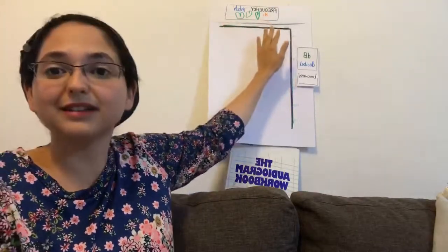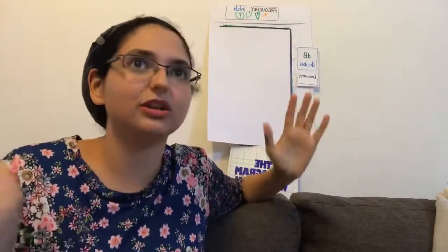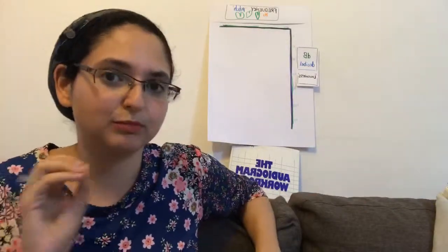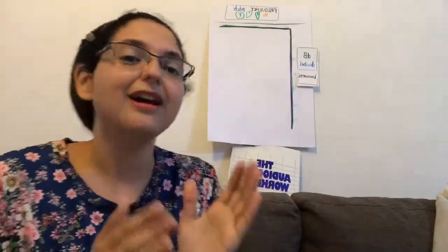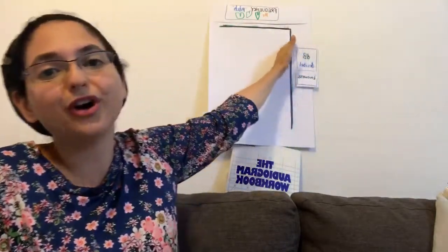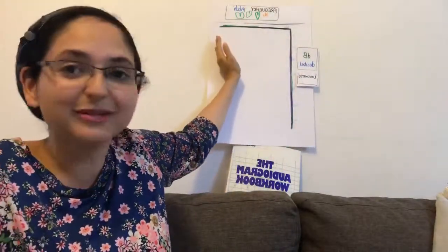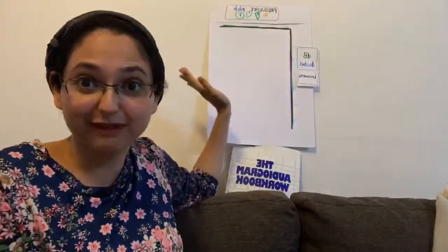So when you have the results graphed out, when we test hearing, we don't just play one sound and say, did you hear that sound? We play a lot of different sounds. Low beeps like boop, boop, boop, boop, and super high beeps, beep, beep, beep, beep, beep, like birds, right? And all the sounds in between from 250 hertz to 8,000 hertz, right? So we're getting results from the low frequency all the way through to the high frequency. And so that's what it means when something is on the left versus the right.